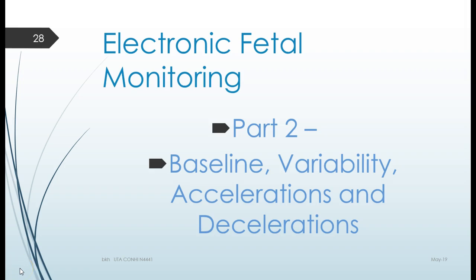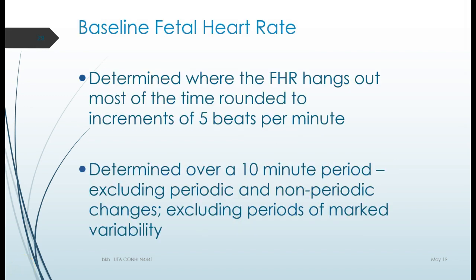Welcome to part 2. In part 1, remember we reviewed just the basics and some of the rules about fetal monitoring. And in part 2, we're actually going to dive in and learn how to read the strip. Remember that to determine the baseline, it takes a 10-minute time frame to establish a baseline.